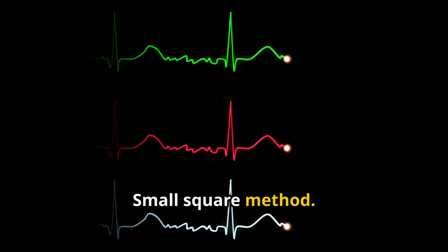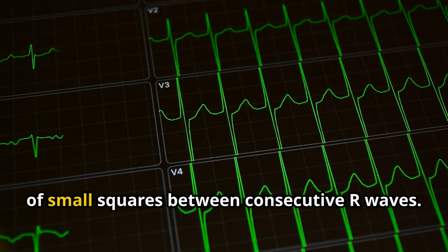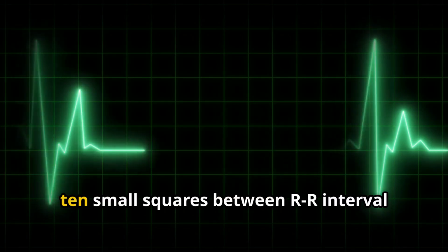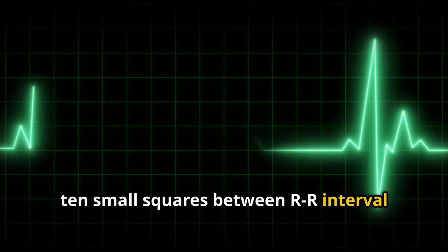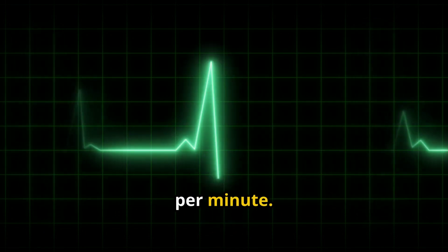Small square method. 1500 is divided by the number of small squares between consecutive R waves. For example, 10 small squares between RR interval implies a rate of 150 beats per minute.